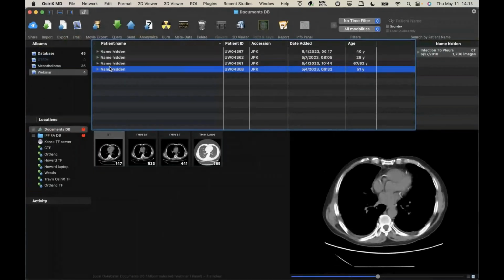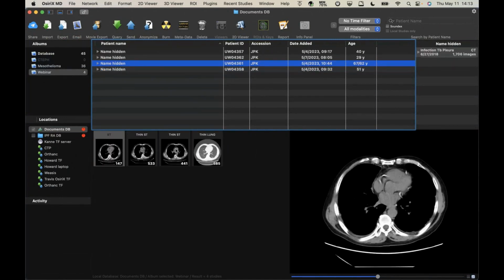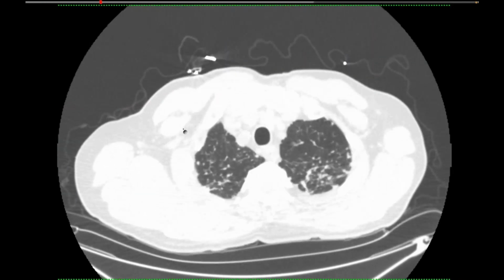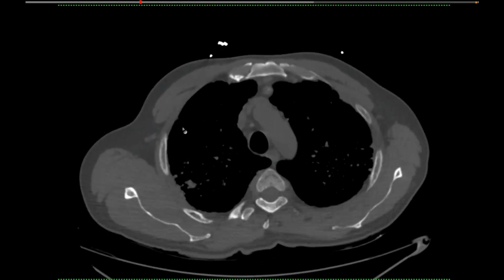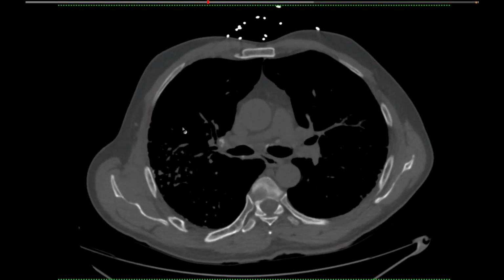So Jeff, do you think that the lung calcifications are just part of the sarcoid? I do, because they pre-existed the pleural disease, and if you look at them, they're all perilymphatic. Let me get a bone window here. Right. I think it's all just sarcoid. It's not that common for sarcoid nodules to calcify, but they do. That's why I was wondering if this was silicosis.